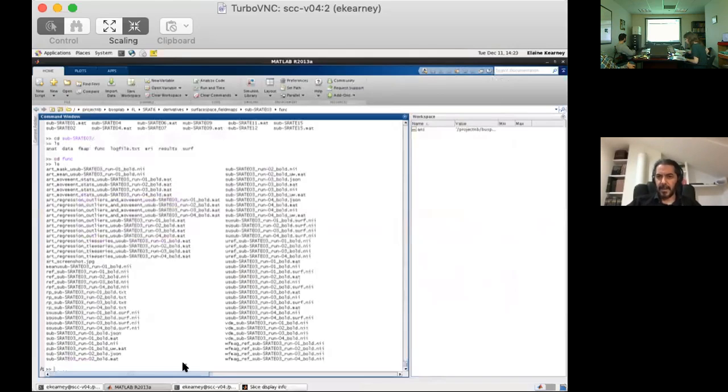Right, yeah, I can see those. Okay, so if you can then just type spm underscore check underscore registration. Yeah, and then the names of those two files. With just a space between them? Yes, with a space between them, exactly. And that will show you basically side by side these two images, the before and after warping, and allow us to look at to what extent the correction did something, or it did something wrong, or it did something in the opposite direction.